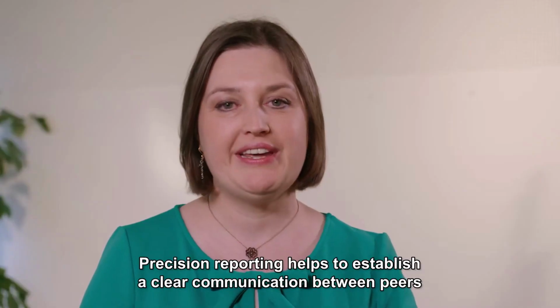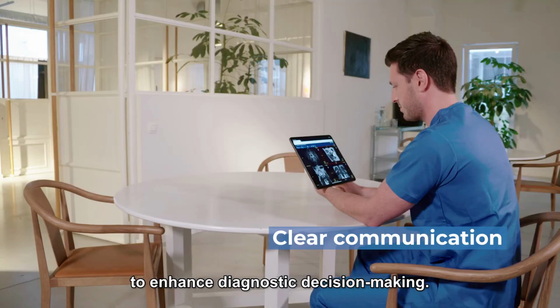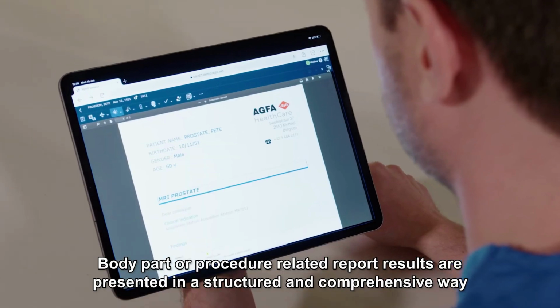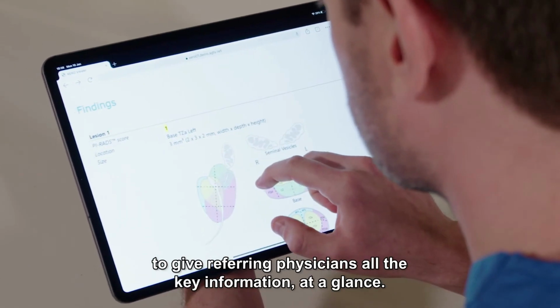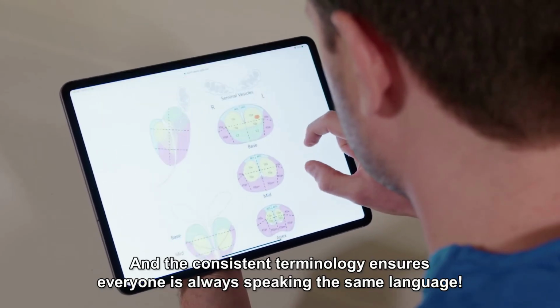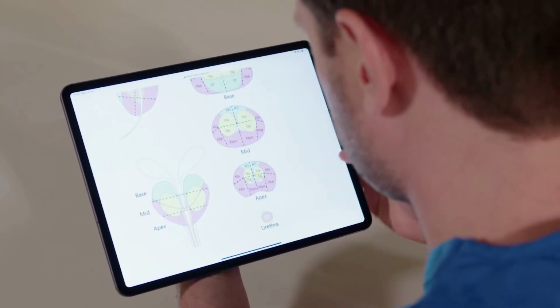Precision Reporting helps to establish a clear communication between peers to enhance diagnostic decision-making. Body part or procedure-related report results are presented in a structured and comprehensive way to give referring physicians all the key information at a glance. And the consistent terminology ensures everyone is always speaking the same language.